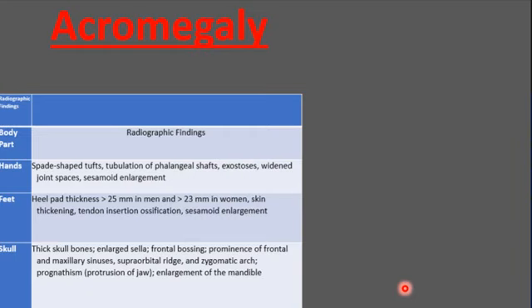Acromegaly, these are radiological findings in the hand.